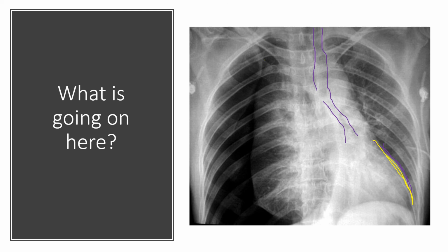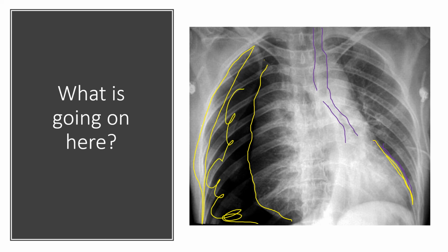Notice here that you have this line, right? This is their rib cage, and all this is very radiolucent, right? Lucent, Lucifer, dark, right? All this is radiolucent in here. So this is a tension pneumothorax. So this is air in that pleural space that's crushing the right lung against the left side. That's why the trachea is shifted. And that is a board exam question.